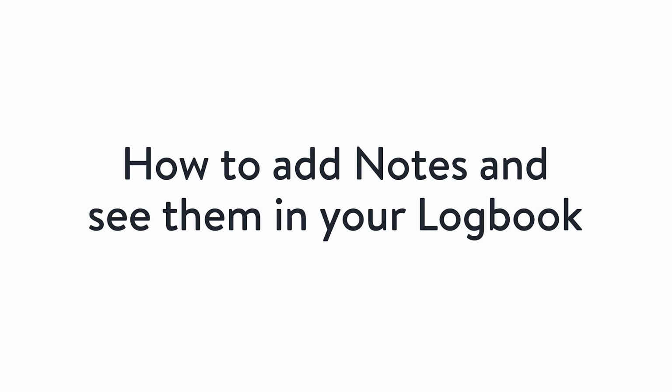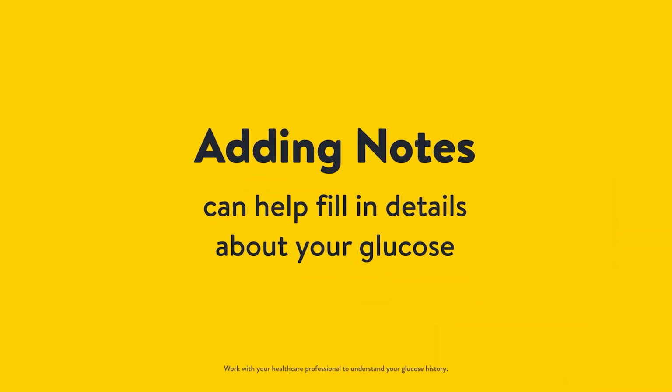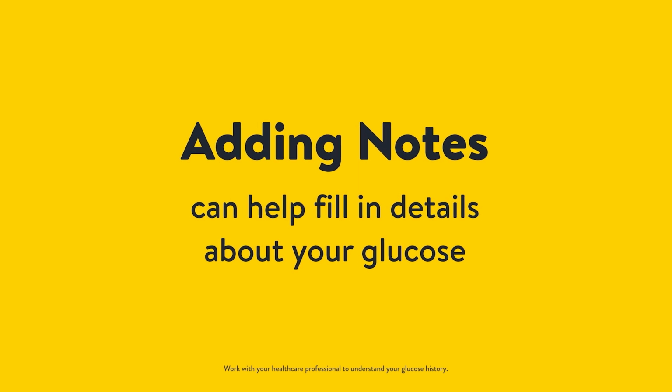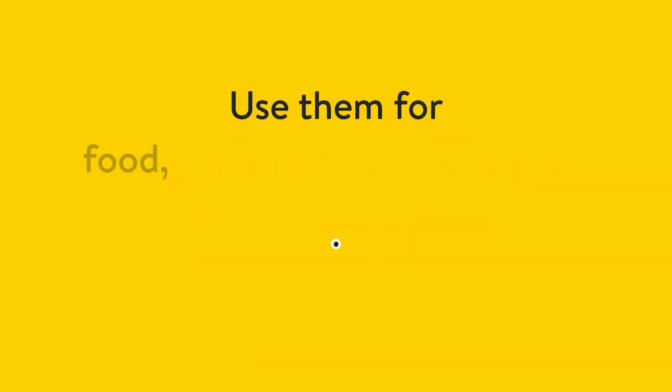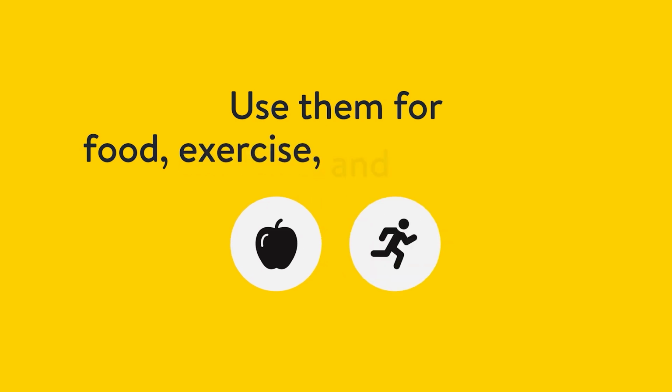Now we'll review how to add notes and see them in your logbook. Adding notes can help fill in details about your glucose, so you can keep making progress. Use them for food, exercise, and other notes.